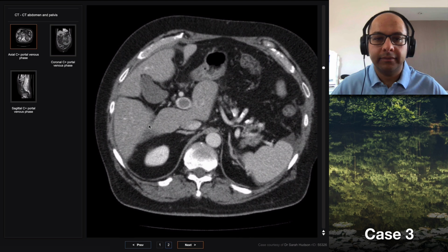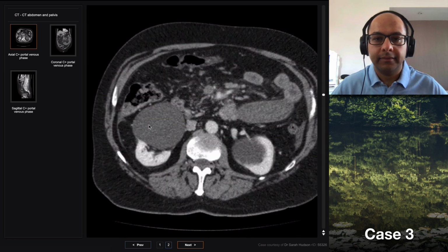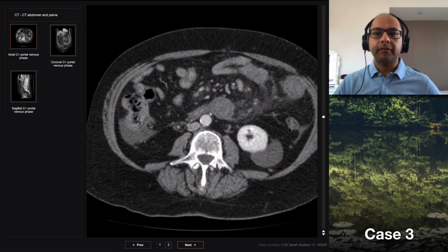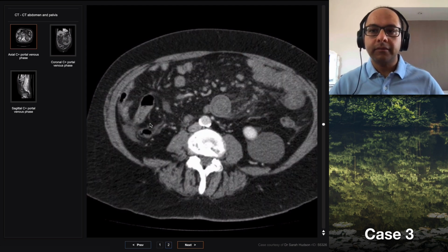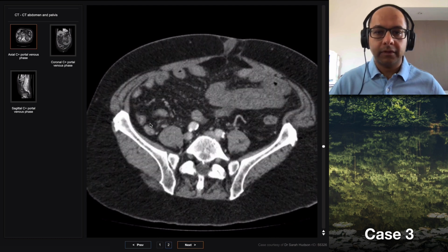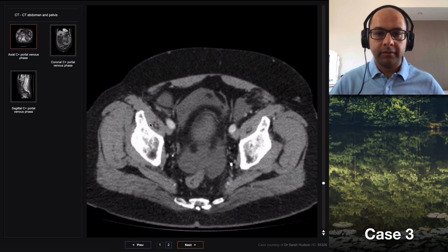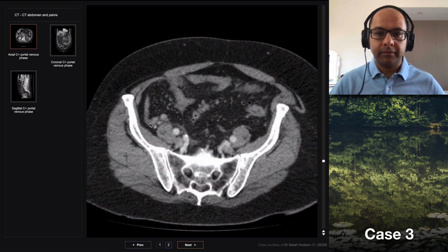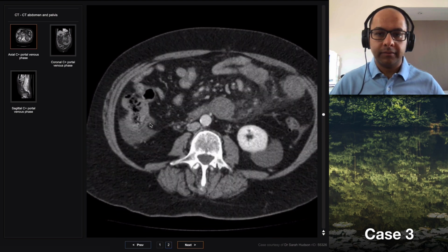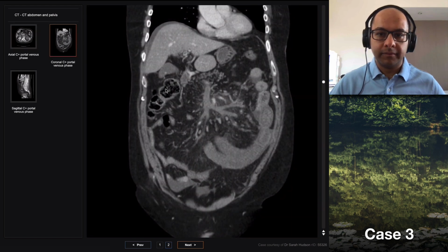There is a frank non-occlusive thrombus seen at the main portal vein that extends to the main branches. It extends down to the SMV, which causes total occlusion of the SMV and the branches of the SMV as well, draining the small bowel. There is a loop of small bowel, particularly the jejunum, which shows a mural thickening and submucosal edema with surrounding fat stranding of the adjacent mesentery.